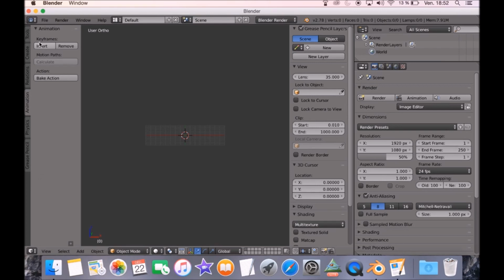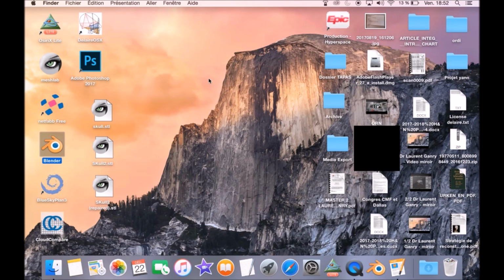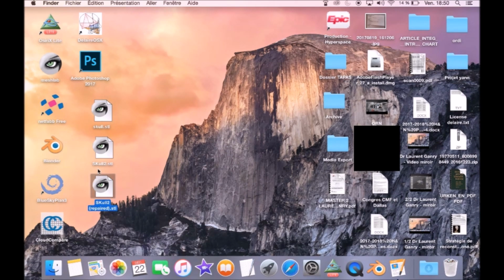And basically that's it. I will do another video to explain exactly all the 3D modeling, and I hope that will be enough for you to understand how easy it is to prepare a 3D object.